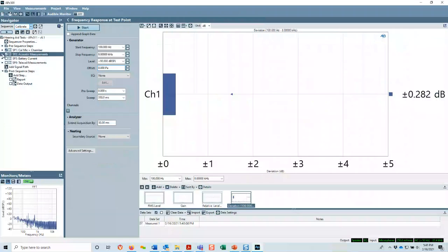Next, we'll pick the test device under test sequence. And if I hit the run sequence button, the system will run through the hearing aid tests. So first I have a prompt to enter the device ID. This could be the model number or the serial number of the device. And as shown, there's a barcode here in the picture. I could use a barcode scanner. I don't have one hooked up, so I'm just going to enter a number 1, 2, 3, 4, 7, 8.